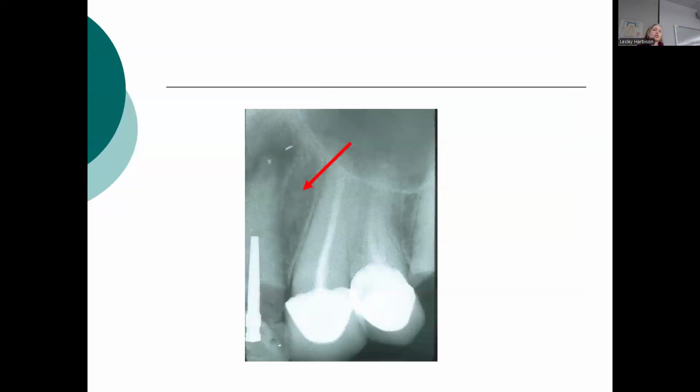What's the red arrow pointing to? Yeah, and that's a hard one. That's a hard picture to know, but you get to the point where you think, okay, that's a weird picture, it's not a good picture, but this is the inverted Y. I can kind of pick it up. And even though this doesn't look like a canine, that kind of looks like a premolar. So my best guess is that's going to be the lateral fossa or the canine fossa. So there's a finite amount of landmarks that you have to learn.